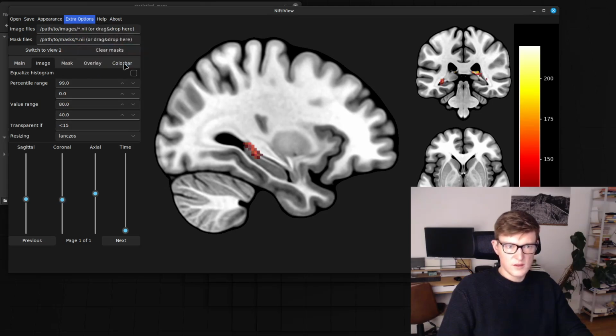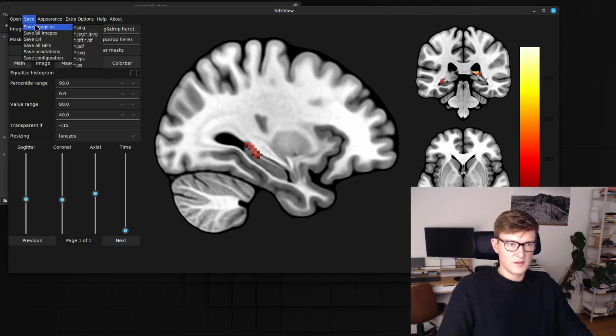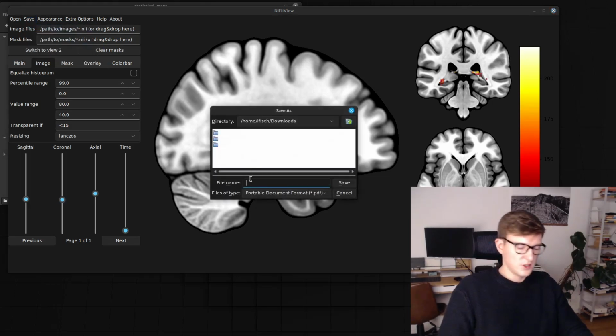Pad color transparent. Okay. And now a last thing, because we are printing on white paper, we have to change the color of the writing and the lines from white to another color. In this case, let's use black. Now it's harder to see on this background, but once we've saved it as, for example, a PDF, because PDFs are not restricted to an image resolution.